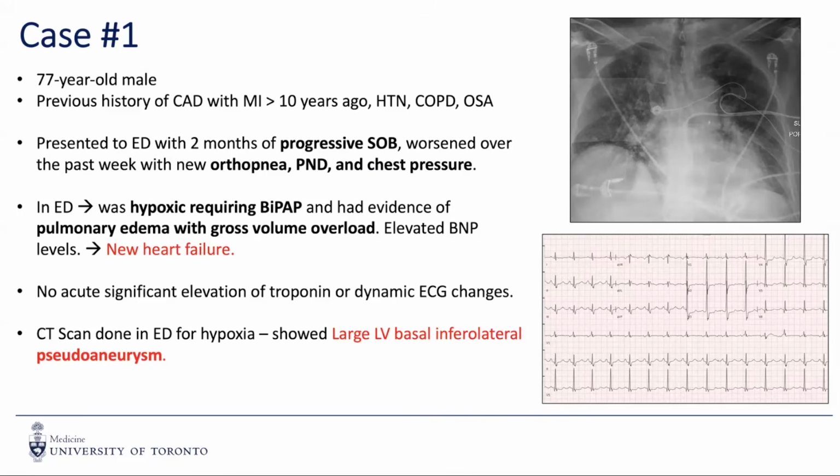But then they had a CT scan that was done in Emerge for hypoxia, which incidentally revealed a large LV basal inferolateral pseudoaneurysm.